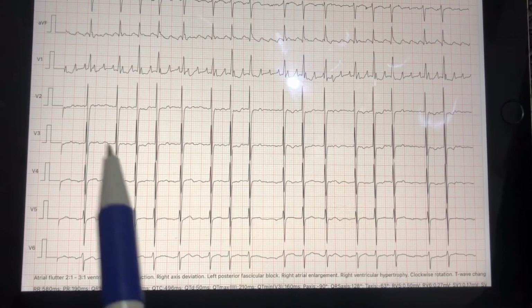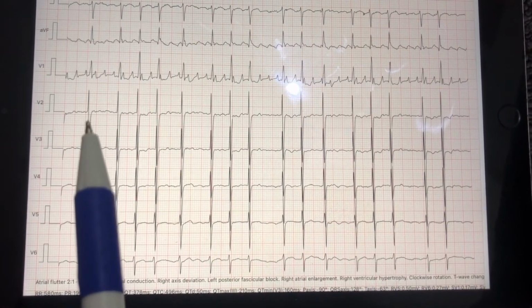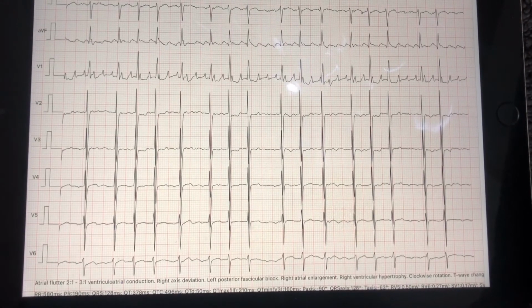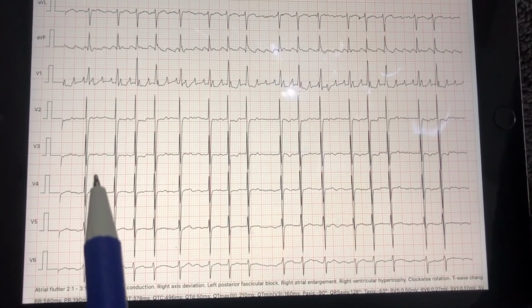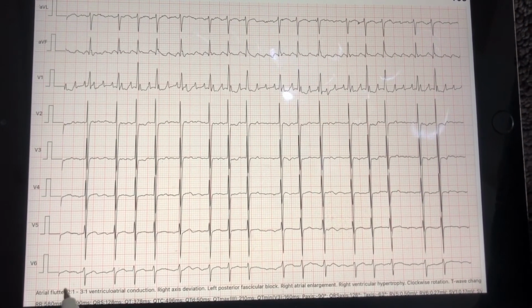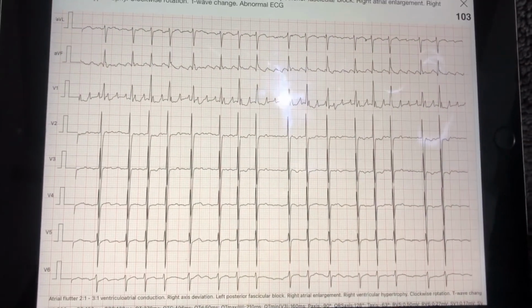But there is one more point: the QRS complexes are actually overlapping the QRS complexes below them. It means that the right ventricle has been enlarged, or you can say hypertrophied, so that it now needs a larger amount of action potential to depolarize it. So these are the 2 points that are diagnostic for right ventricular hypertrophy. One is V1 upward deflected and V6 downward deflected, which is opposite to the normal, and the other is that QRS complexes are larger than the normal.